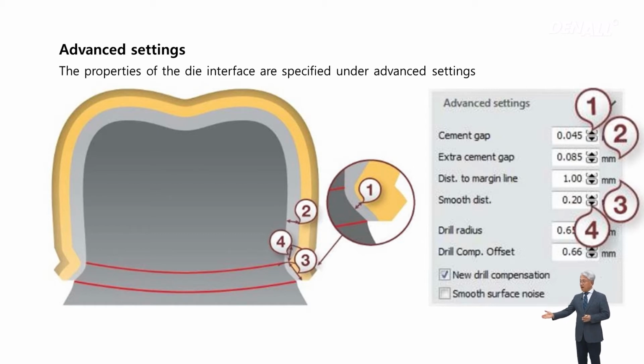As shown in the image, in the margin, the adjustment of the gap can be done at the micron level for the prosthesis on natural tooth and implant abutment, and cement space can be adjusted at the micron level. When you mill using a CAD-CAM machine and print it out, with just a 3-4 micron difference, the prosthesis can feel loose or tight. You can adjust up to the 3-4 micron level. Therefore, you can get a very precise result, which is better than the prosthesis you got with casting. The precision, accuracy, and reproducibility is much better.